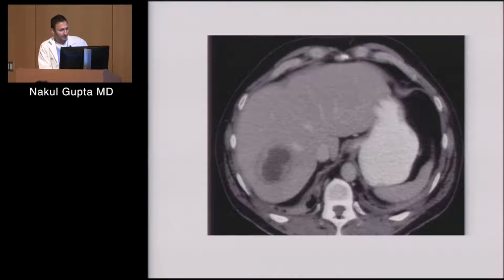So here we go. Assuming this is the same patient, it has been further complicated by, I'll let you guys decide what to make of this real quick. So this is the liver, and within the right hepatic lobe, we have a hypodense fluid collection with a thick rim, and this is a liver abscess. One of the complications of any intra-abdominal infection is the formation of liver abscess, because the bacteria work their way into the portal venous system, and from there they can set up shop in the liver and you get abscess formation.